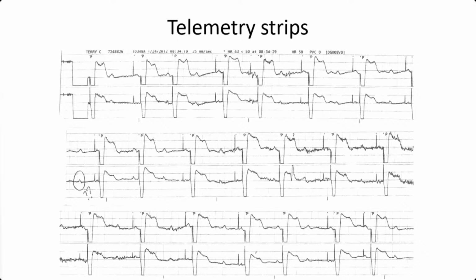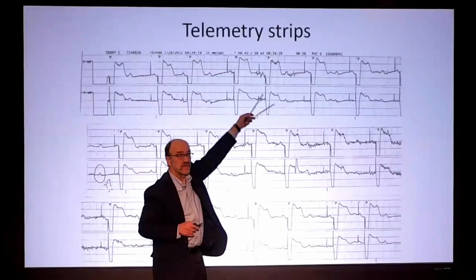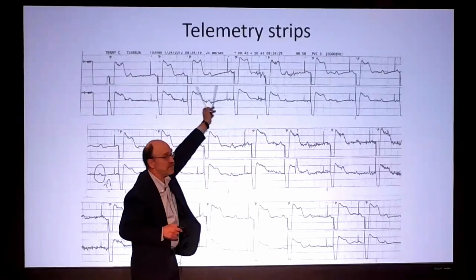Okay. And then there's a paced P wave, and then a bi-V pacing capture, and then the sensed P wave, another bi-V pacing, and then it seems like another undersensed P wave, and then another paced capture beat for the atrium.